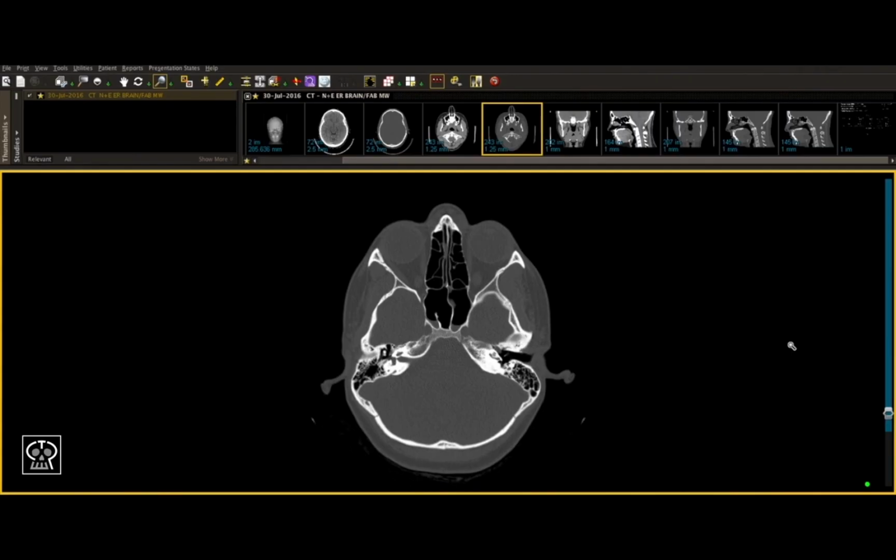At this point, I would consider our view of the axial view of the mandible finished and no fractures identified. As I mentioned before, the axial view is the most crucial view for almost all fractures, and it's rare that you won't see a fracture on the axial view but will then find it somewhere else. However, because it is possible, we always make sure to look at the coronal and sagittal views as well.